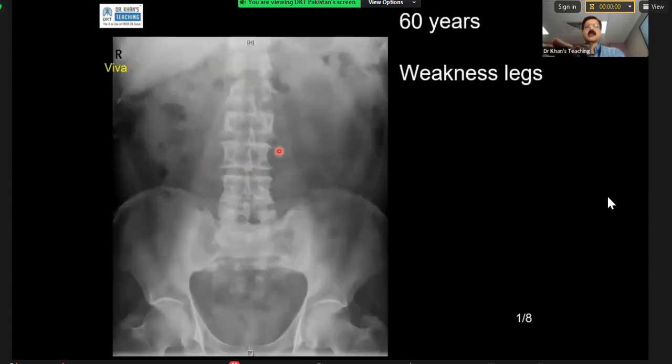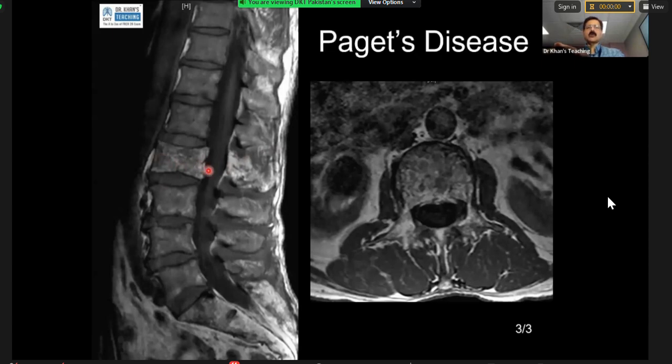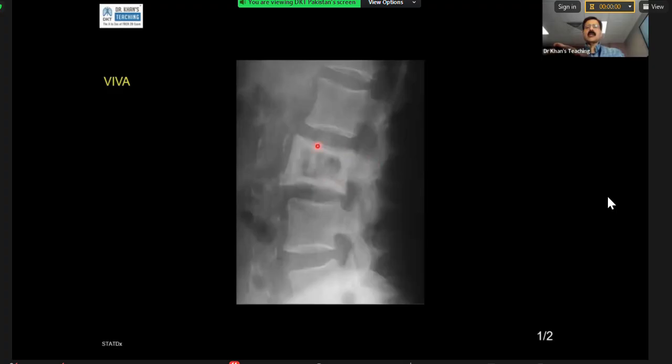If you see here, look at the mediolateral dimension. It is slightly bigger. It is a subtle finding where just, from here to here versus from here to here. And you will agree that this is more. But here, that is confirmed. Now, the marrow is normal. And you did well where you just described it. It's normal. Low T1 is bad. This is high T1, which is good marrow. So the finding is just that this is Paget's disease. End of story. Now, this is another.